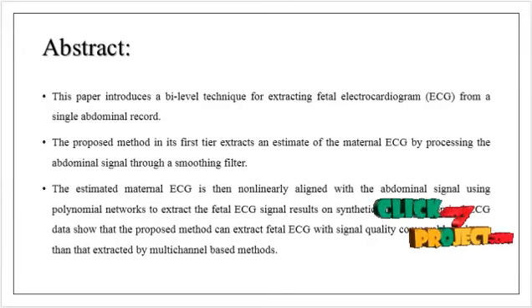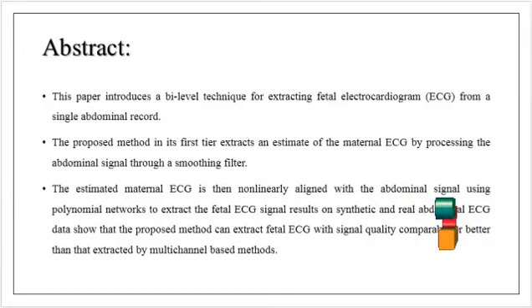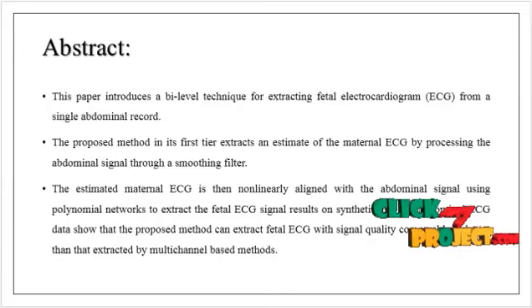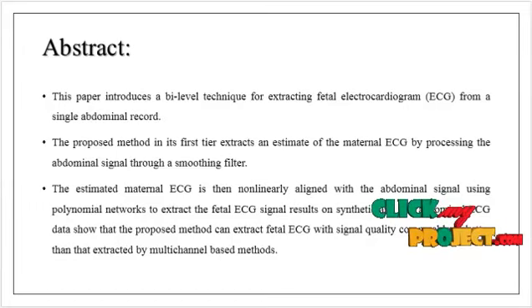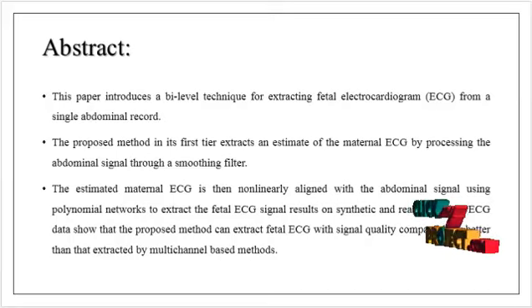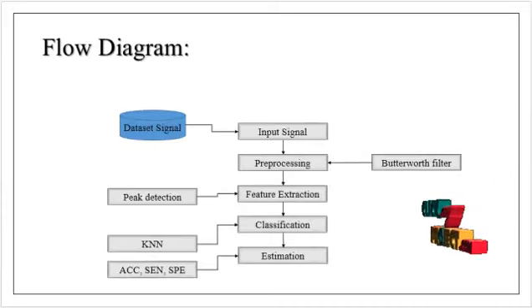Results on the synthetic and abdominal ECG data show the proposed method can extract the fetal ECG with signal quality comparable to or better than that extracted by multi-channel based methods. Hence, this method works well to extract the maternal ECG from the abdominal regions, and then it extracts the fetal regions separately.